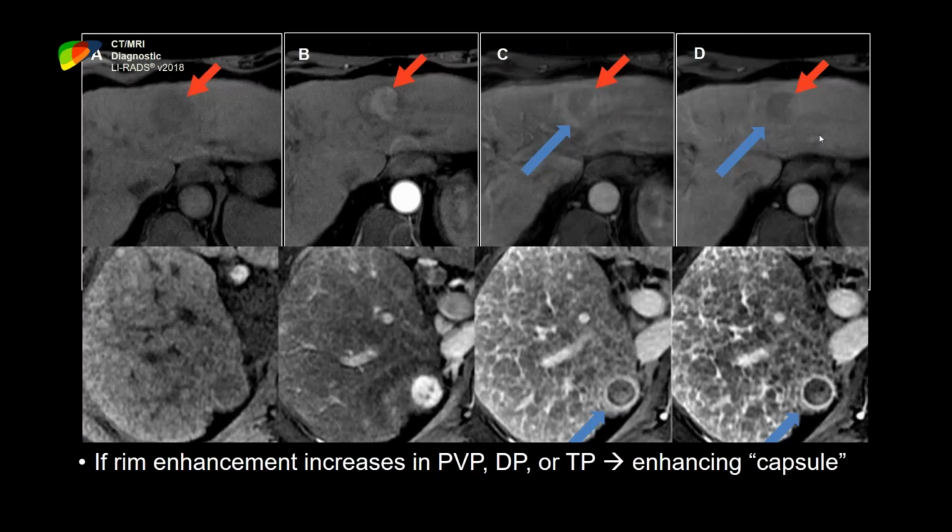I'm from UAMS. Continuing on the topic of arterial phase hyperenhancement, it looks like it's a gray area, because you showed a pitfall case where it's T1 hyperintense and it seems to enhance, but if you look at the subtraction, there is no enhancement. So the phrase "some enhancement" is confusing, because either it's enhancing or it's not.